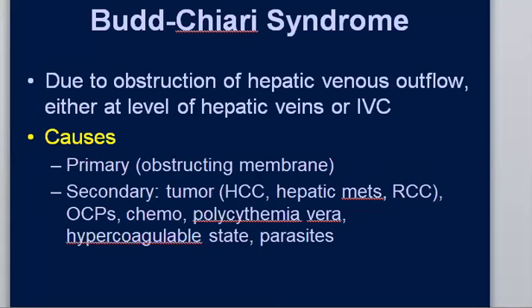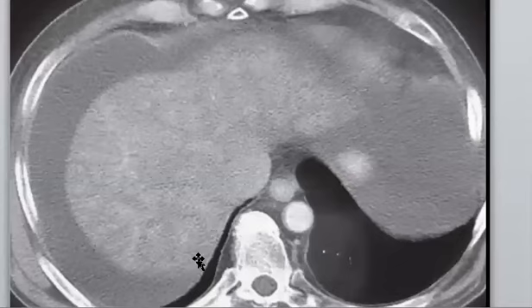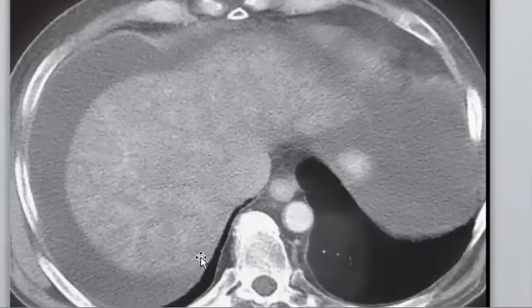This is what is called the flip-flop appearance. Don't forget that the caudate lobe is spared. Okay? This case, what do you think about it?